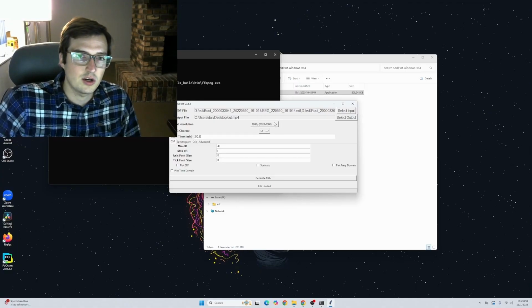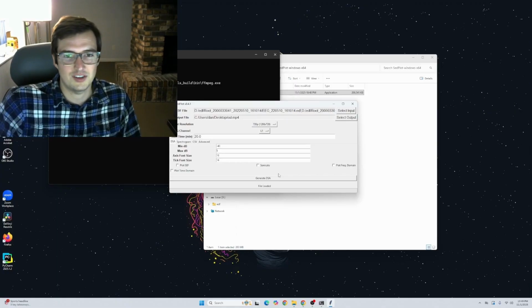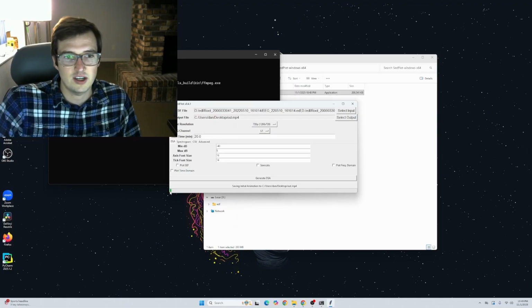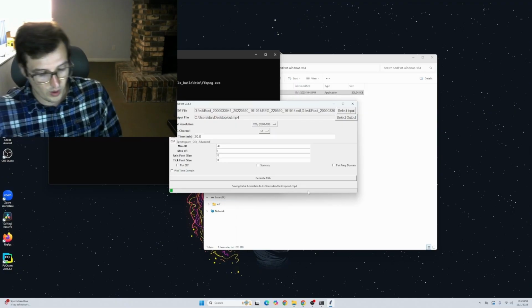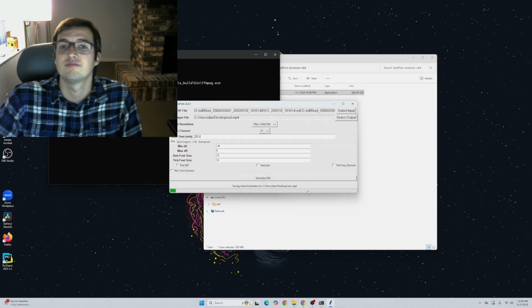And I know that it's a little faster to render around 720p. So just lowering the resolution makes it render a little faster. So yeah, as soon as I hit generate, I get some output. It's starting to save the animation, and my loading bar is progressing. So everything seems to be working well. I will check in with you in a second when this video is done rendering, and we can look at what's in the actual file.